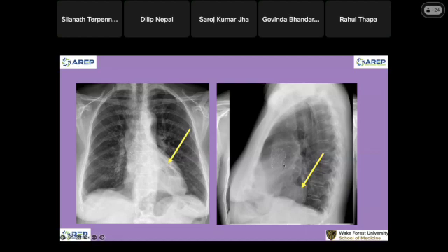Either prior surgery, maybe lobectomy or pneumonectomy, or the patient has obstructive atelectasis. This is the location of the aorta, and this is the left ventricle. This is lung volume loss, and the atelectasis is pulling the heart and the trachea towards the left. This is the aortic arch, what I can guess from here.